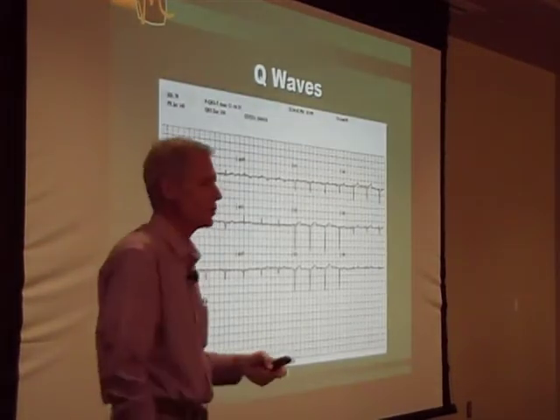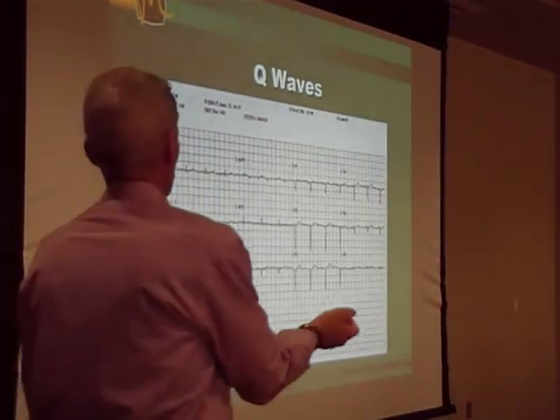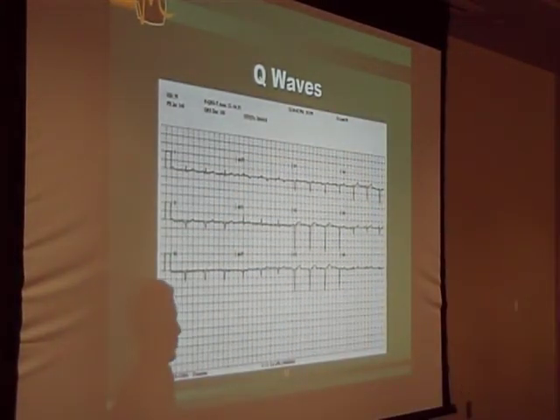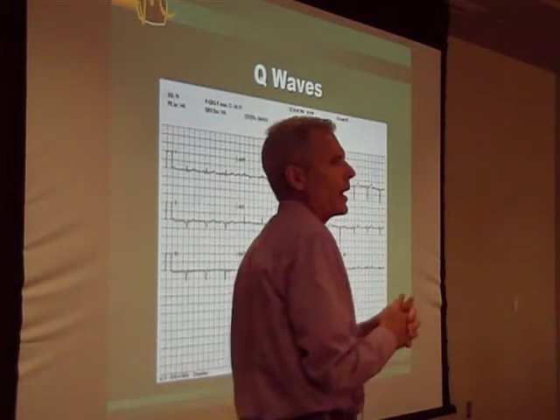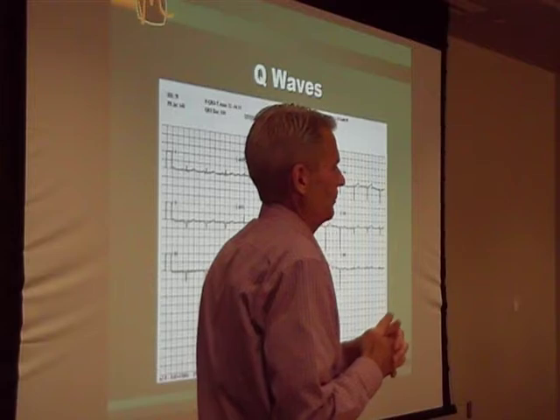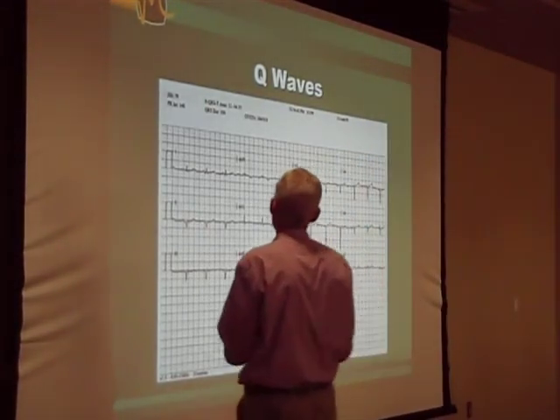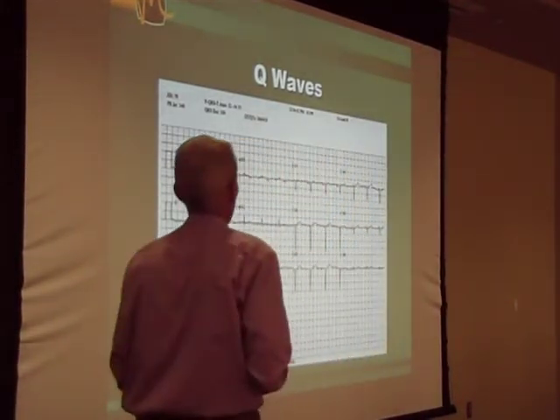So look at the EKG on page 11. I will tell you that there's no current ischemic event here. That there is evidence on this EKG of 2 previous MIs. Who can tell me where they're at? Anterior. Why do you say anterior? The R wave progression's completely obliterated. There you go. Predominant negative deflection. Good.